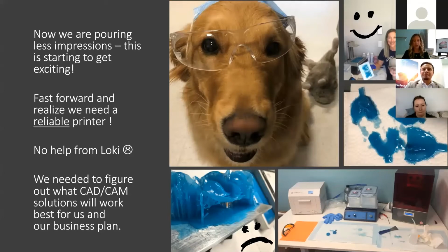We're starting to scan our impressions. We're starting to make our trays and night guards. We're scanning our models. We're sending out our RPDs that way. Lots of failures with this printer. So again, just fast forwarding, we needed to find a better solution.